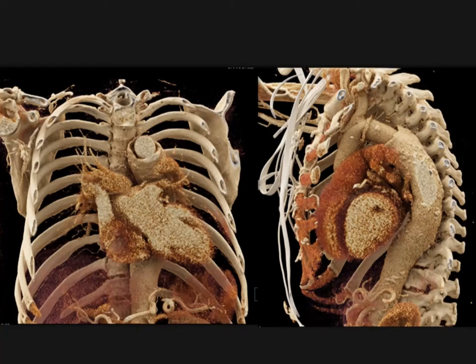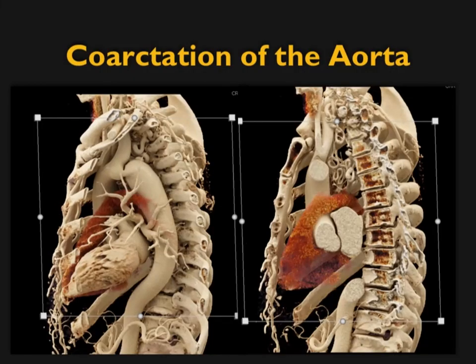But again, here's some of the visualizations. So the more complicated the surgery, the better a cinematic rendering works. And here's another example. This was a coarctation. Left subclavian artery, there's the coarctation just past it, very classic. Interestingly, it was an adult.